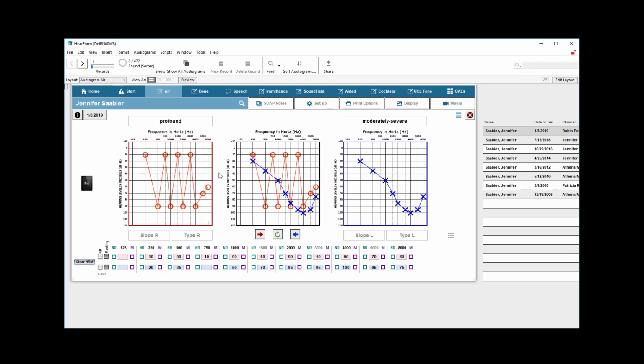I didn't get that in very well. So the same is true over on the left here. You can change it, or you can have the system calculate that based on the formulas that we discussed earlier.